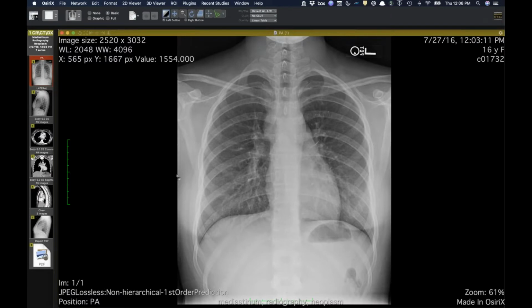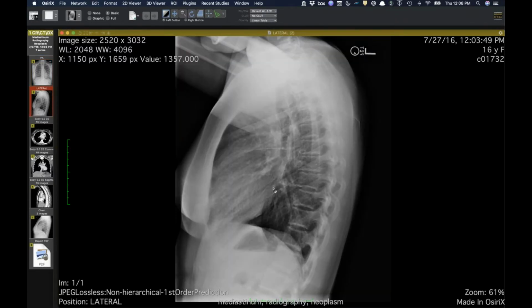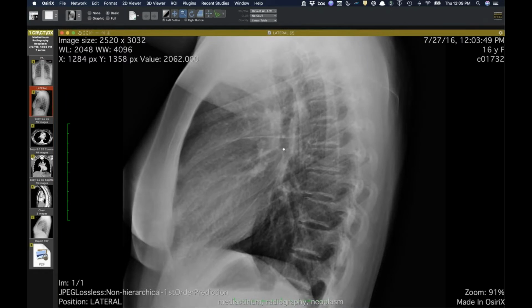So this one, I'm curious what you guys think. Now, the radiograph from a few years ago, 16-year-old, healthy. The only symptom she had at a physical was that she had a right cervical lymph node that was reportedly enlarging and slightly more firm, but very athletic, active in athletics, no B symptoms. So you can see the radiograph at the time, she does have lymphadenopathy, right paratracheal, AP window here. I think there was some subcarinal lymphadenopathy as well. Not really all that obvious, maybe a little increased opacity here.